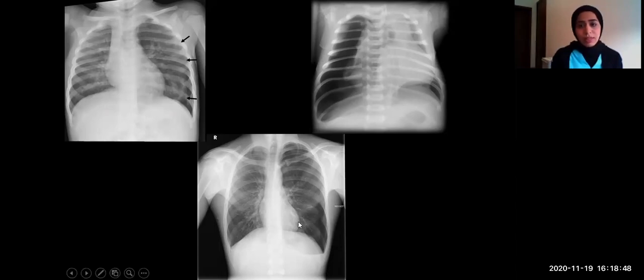This is another patient with mild tension pneumothorax. As you can see, this line of pneumothorax, which is small, but started to have a tension effect upon the adjacent lung tissue. The lung started to be medially displaced, though the mediastinum is still central.